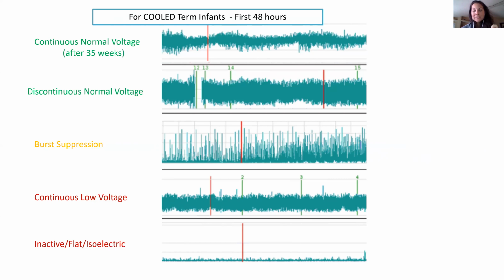Remember, every 15 seconds, it does that maximum, minimum. That minimum comes from that integration, the degrading of the signal. The longer there is suppressed activity, the lower the pattern gets. And so we want to really look at that lower margin. It's so important. We do just kind of eyeball the patterns, but looking at that lower margin is so important. I don't know how many more times I can say that today.